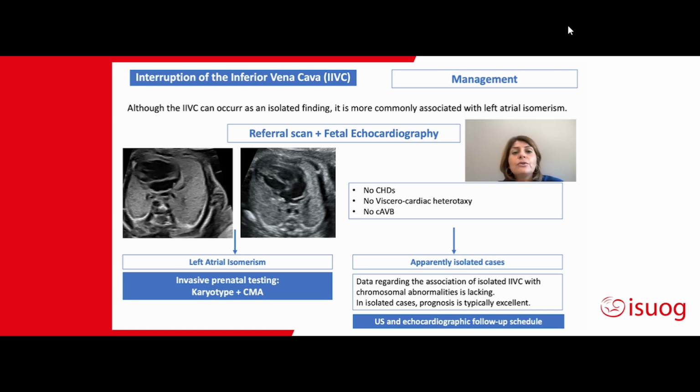However, to diagnose this condition for sure, the presence of two atrial finger-like appendages, as you can see here, is fundamental to reach the correct diagnosis. However, this evaluation is not always feasible in prenatal life.